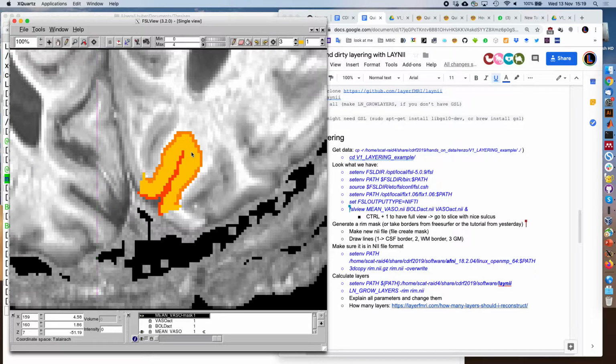In Windows, you can just double click. And obviously every tool does it differently, like FSLView does it slightly differently. I think ITK-SNAP does it quite effectively also.